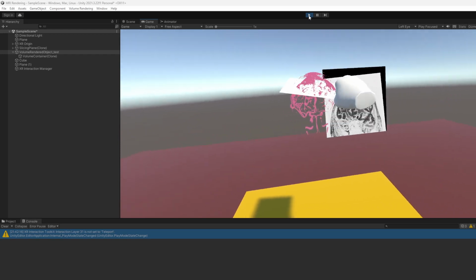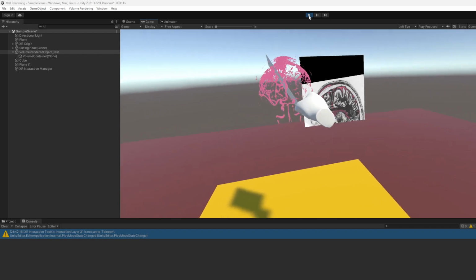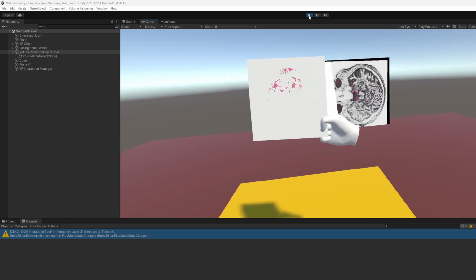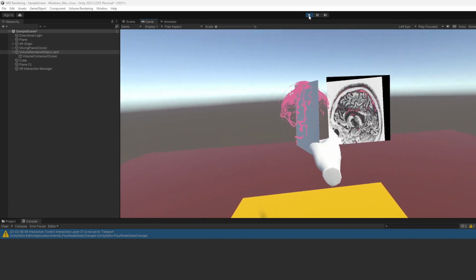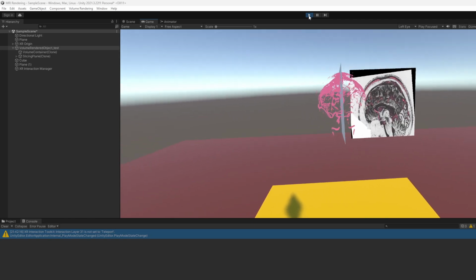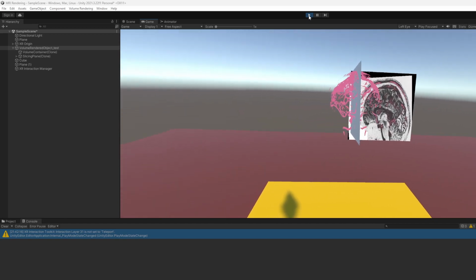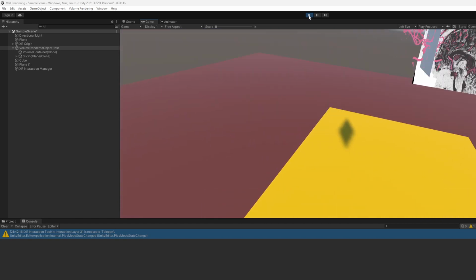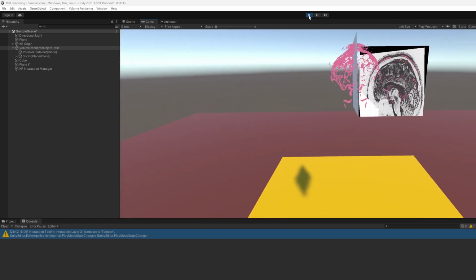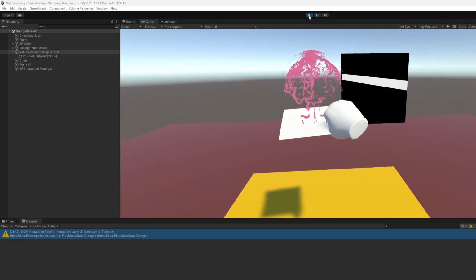And you can get some interesting bits. You can see the main structure of the brain there, but the eyes are up here, I think. I don't know. Anyways, you can see some interesting bits and bobs, and it's a more naturalistic technique for interacting with the MRI data than was previously possible. I'm sure someone's done something similar to this before, but that is typically done in clinical settings. It's also pretty fun to just play around with.